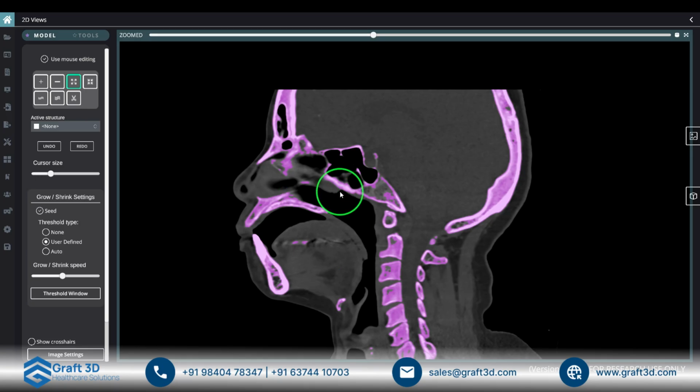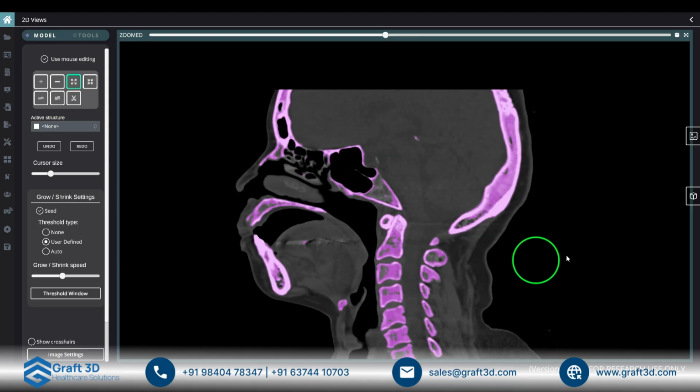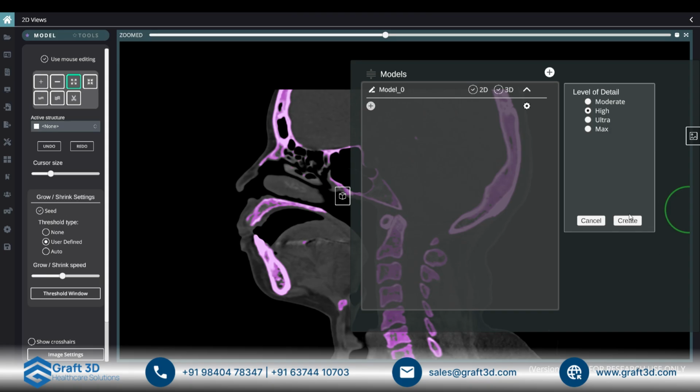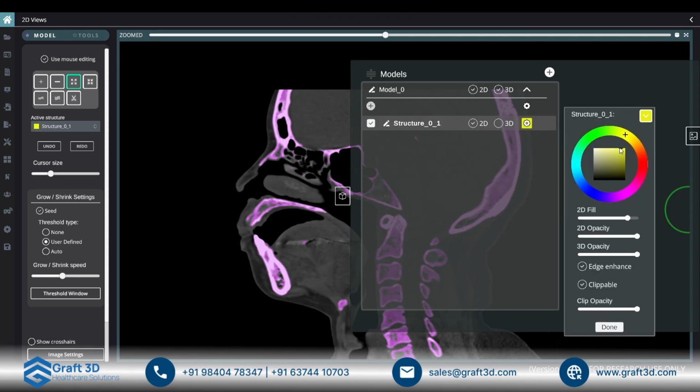All right, so we're going to go through how to segment all of your required structures. We're going to start off with the bone, because arguably that is the easiest piece of anatomy to segment. We're going to follow the exact same steps that we've done in our one-on-one training. So of course, we're going to just create a nice structure that we're going to label bone.